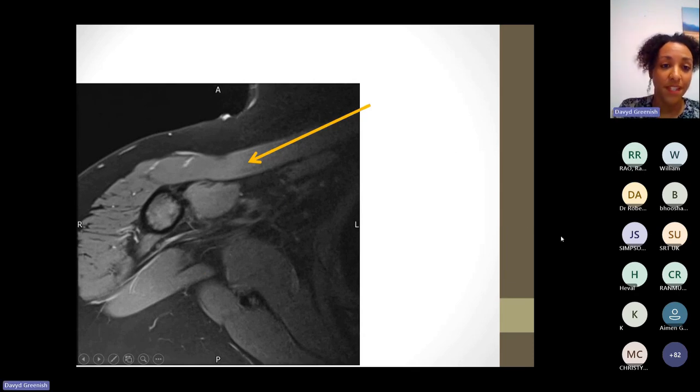Slightly trickier perhaps. I know you know that we're on the shoulder part of the presentation, but that's cheating. So let's apply first principles. How can we orientate ourselves if we're presented with an MRI slice like this? Because it can be hard. Okay, this is fat. I mean, it's a fat suppressed image. That's why it looks dark, because you can sometimes have fat where it looks bright, where you haven't suppressed the fat. We've got black outlining this structure here.